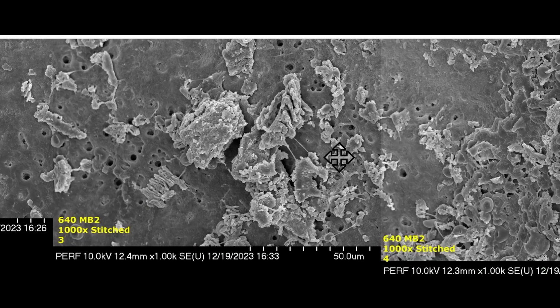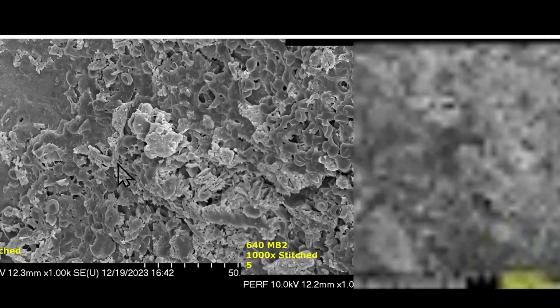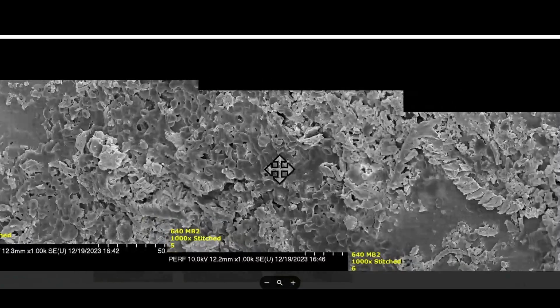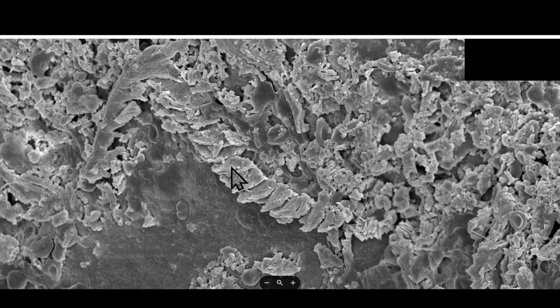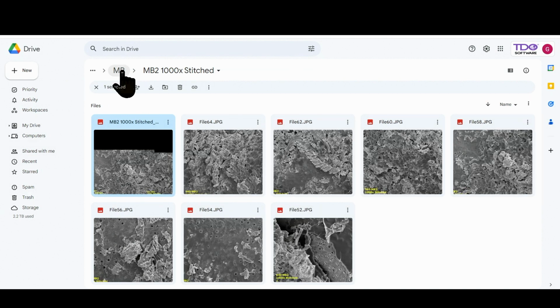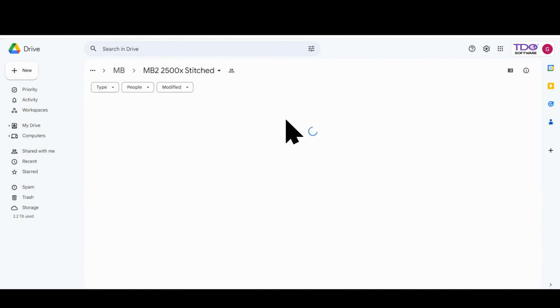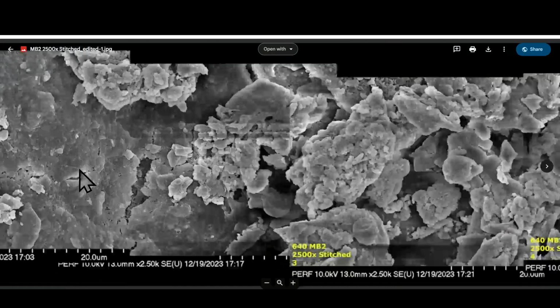This pleated look is very characteristic of laser use, and I have not seen that where the laser is not used. You'll see this occasionally with GentleWave too. You get the layered look of the pre-dentin, which has not been completely decalcified or demineralized. And here's a little bit higher magnification stitched image.